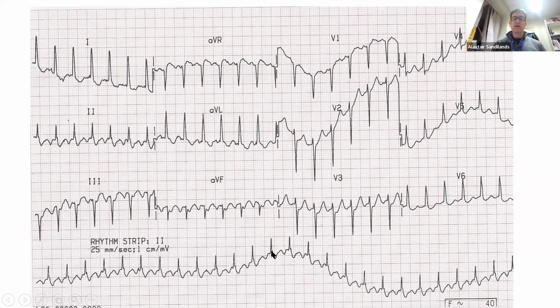Okay. So our next question, is the rhythm regular? Yeah, it's certainly regular. The spacing between every QRS is the same. In actual fact, the rate is about 150. That's quite interesting. You've got two large squares, the rate is 150. Okay, are there any P waves? Yes, there are definite P waves. Are they discrete? If I go to V1 and look at this, you might think it's discrete there. And then there's another one there, and then you see two P waves like this.